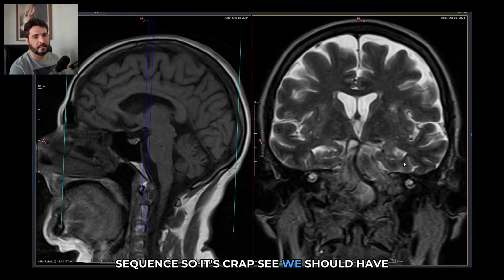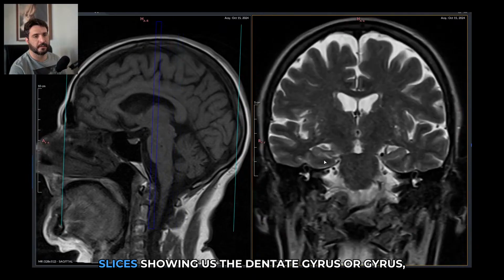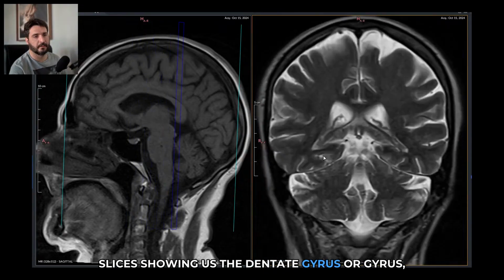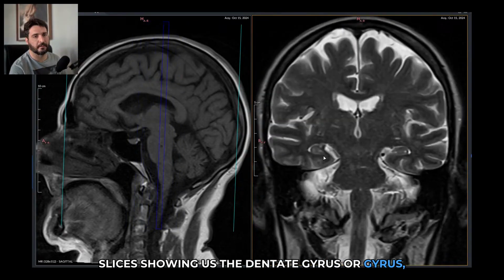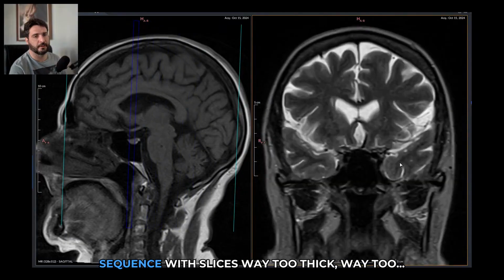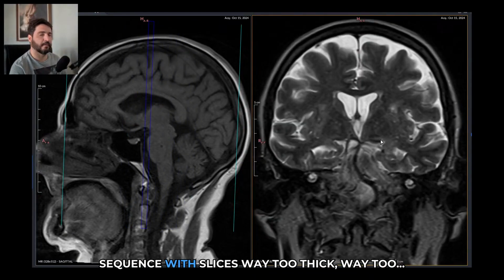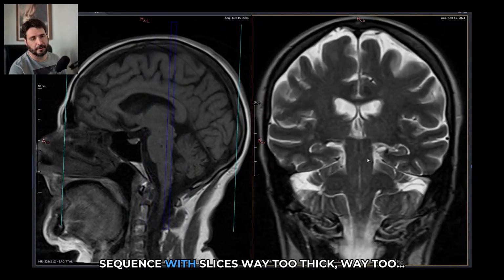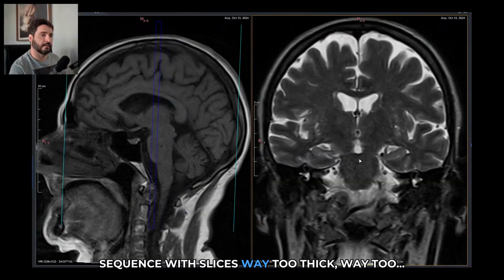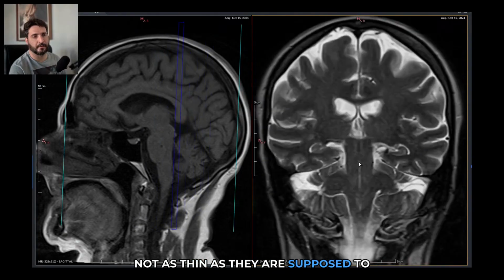We should have at least 2 or 3 consecutive slices showing us the dentate gyrus, but we don't because it's a low resolution sequence, with slices way too thick, way thicker than they are supposed to be.